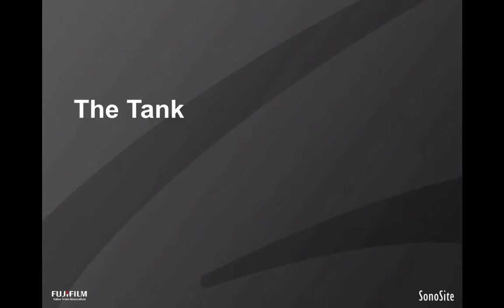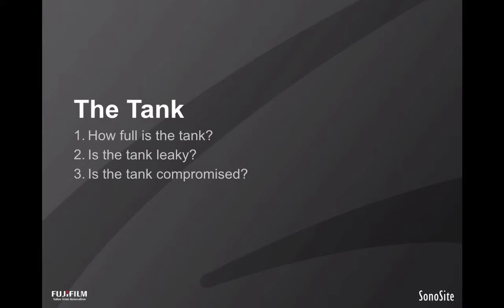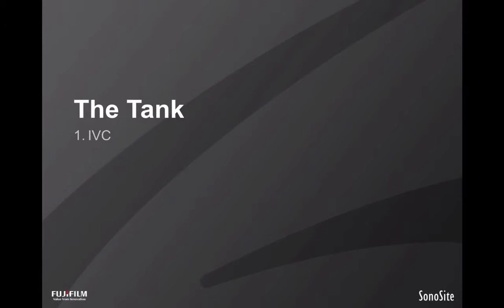The second part of the RUSH protocol focuses on the tank to determine the effective intravascular volume status. First, we assess how full the tank is, whether there is a leak of critical fluids out of the vascular circuit, and if the tank is being prevented from filling. To assess fullness of the tank, we examine the IVC.